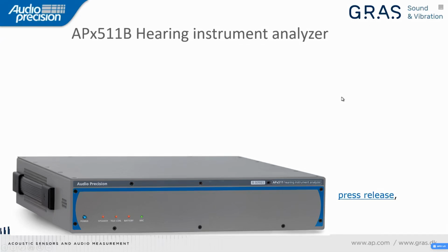Let's talk about our APX 511 hearing instrument analyzer. So this is the analyzer that I'll be using here today. It's a specialized model for hearing instrument test.